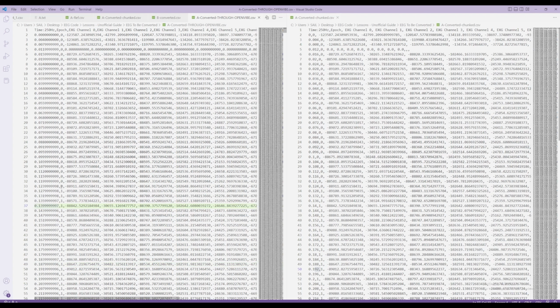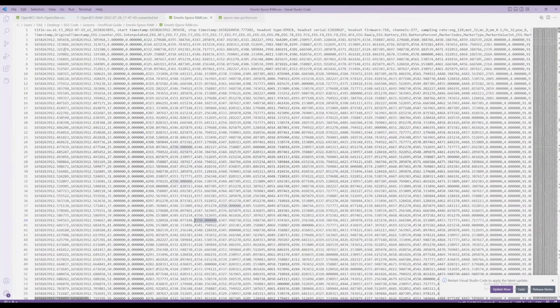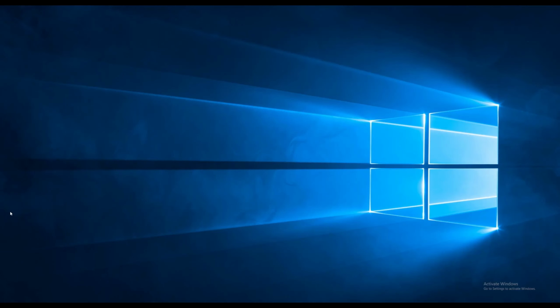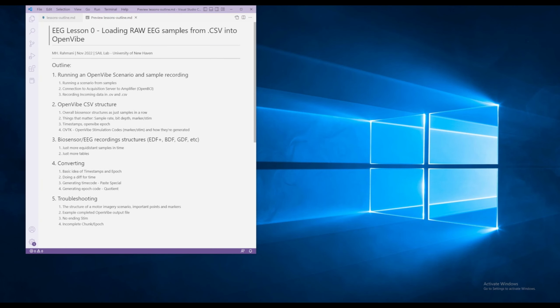It is sensitive to some bits of information, but that's really the easy part. And the tricky ones like timestamps and specific headers or formattings or encodings, none of them are an issue here. So it's quite a great system to work with and start trying out. But things aren't really well documented in the EEG world. This is exactly why I wanted to make a basic tutorial, to simply explain what all of these formats and different environments are expecting. Because when you understand how they work under the hood, you will have a much easier time figuring your way out when you get stuck, because there are a lot of intricacies and not everything is well documented.